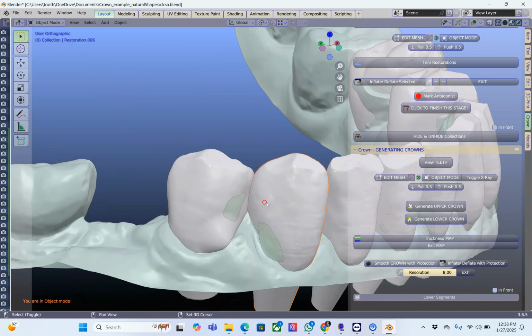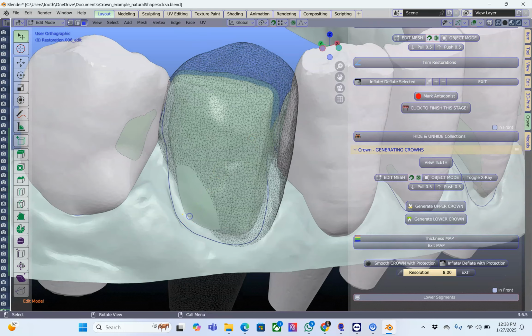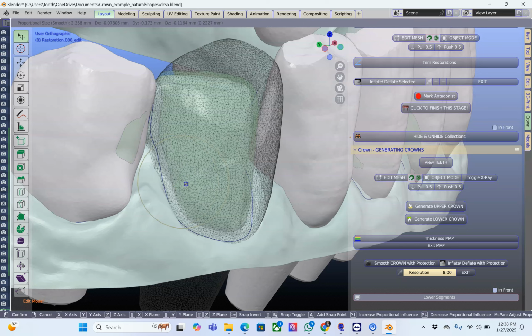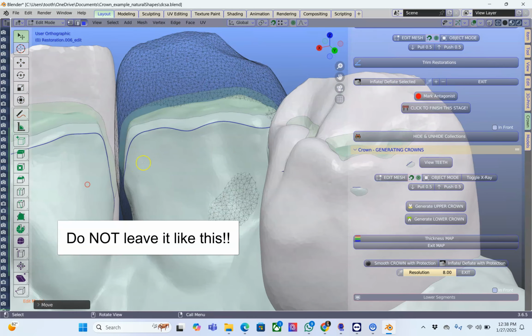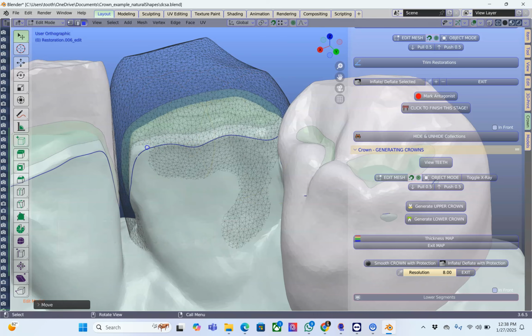I'll just run through all of them individually. You can also, instead of using the G key, just drag it, which also works. Over here, it is absolutely critical that you bring it to the pencil line.